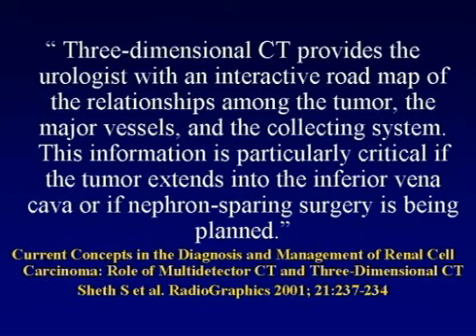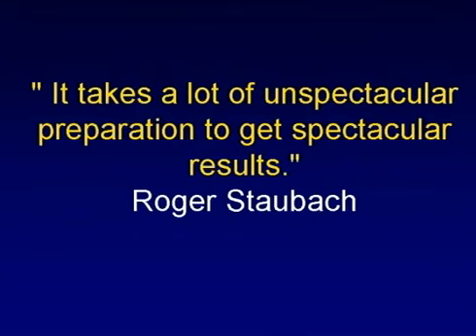And I think in terms of urologic imaging with CT, it's a good quote: it takes a lot of unspectacular preparation to get spectacular results. How good you are, how good your accuracy is, really depends on your protocols and techniques and visualization. The right protocols, the right visualizations, the right timing and acquisition will really increase your success rate to near 100%.